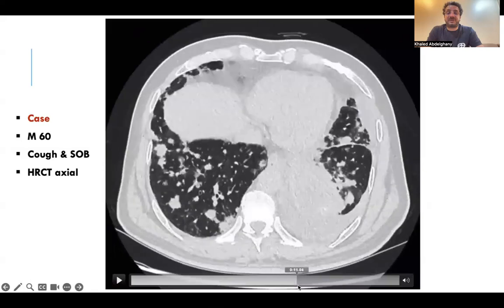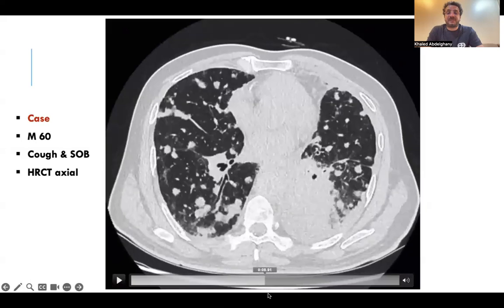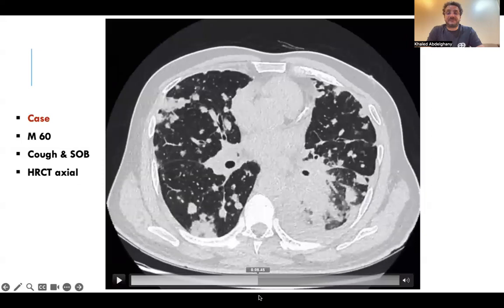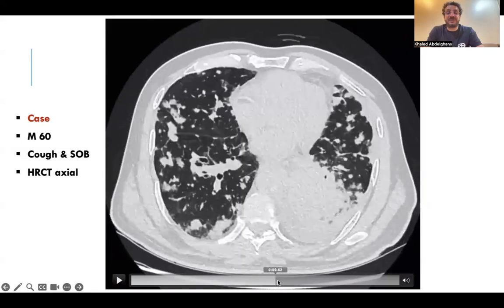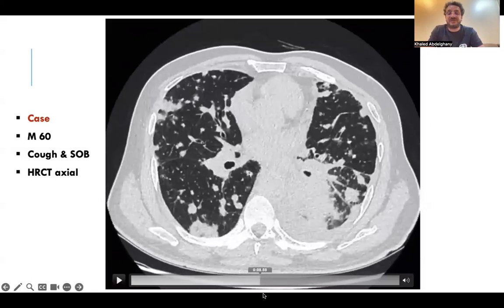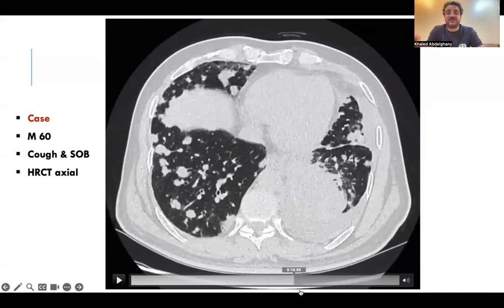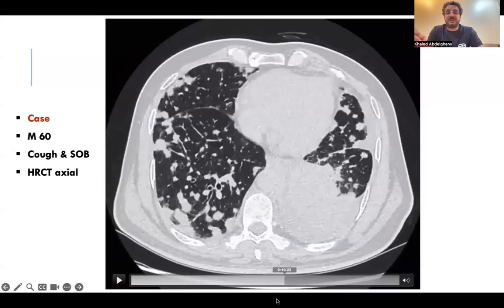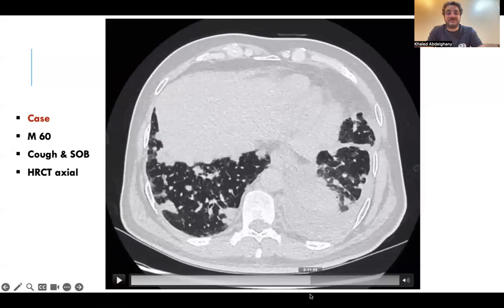And we are having here a case of mucinous invasive adenocarcinoma that can present with a pneumonia-like appearance. And here, placing the nodules in the correct distribution solves the issue. It plays the same role as lymphangitis carcinomatosis. Orientation of the reticulation of smooth interlobular septa can also solve the problem of finding such a pneumonia-like appearance, and this will deny the infection and will be in favor of a neoplasm.